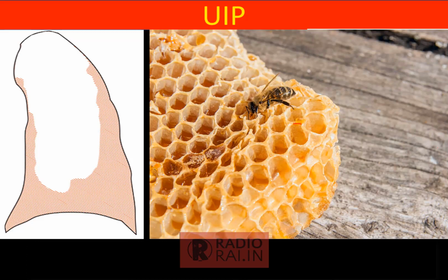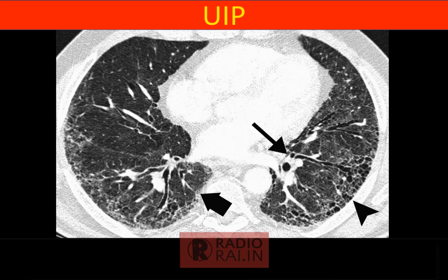This is how a honeycomb looks. We can see multiple cystic spaces which are sharing the wall. Now what are these cystic spaces? These are nothing but the dilated terminal bronchioles and the alveoli. And what is this? The wall is nothing but the fibrotic septations which are present. So reticular opacity, honeycombing, basal predominance is classically a feature of UIP. Here again we can see the basal predominance, where we can see multiple cystic layers.